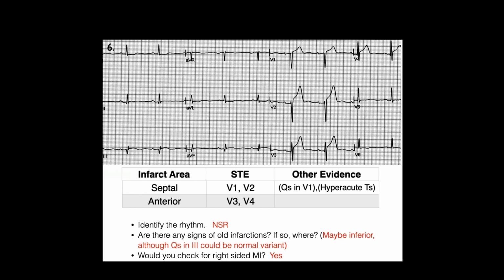It looks like proportionately, there's maybe a little bit of depression in lead 1 and aVL. Would that also be a sign of an old one? No, it would be a sign of something happening now. Okay, but there's certainly not enough.